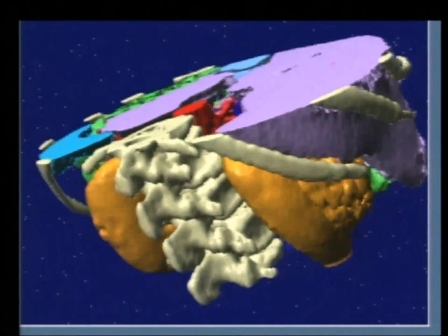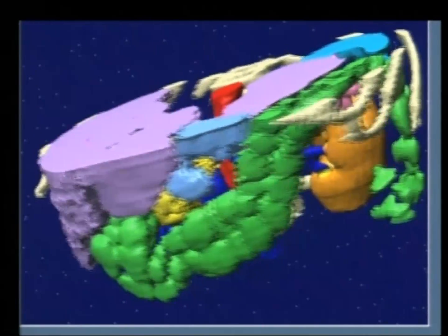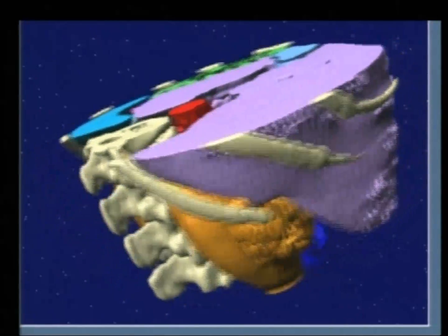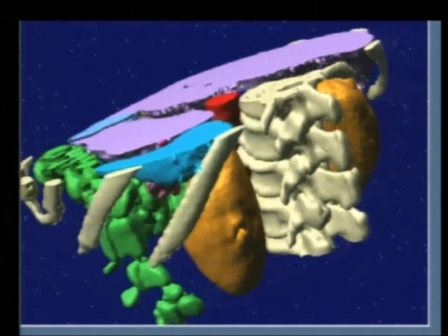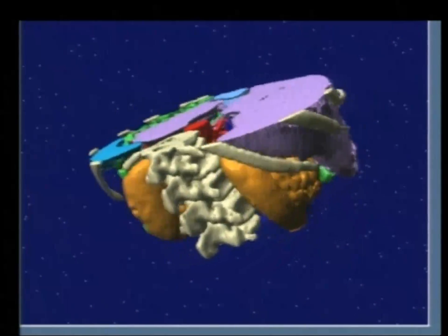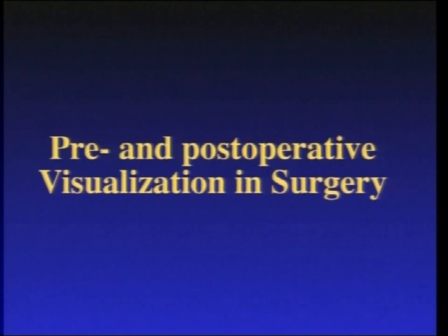This is a reconstruction of an abdominal section generated from spiral computer tomography. The patient had a lesion on the right kidney. It turned out that the diagnosis of this lesion is also easily possible from the native tomograms. So it was one of the early experiences that the value of 3D visualization is more in the subsequent step of surgical treatment, like in craniofacial surgery, which was the first discipline to make practical use of the novel techniques.